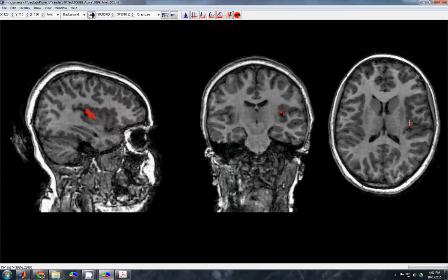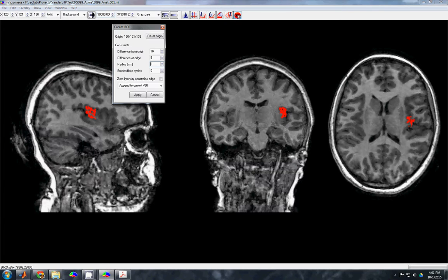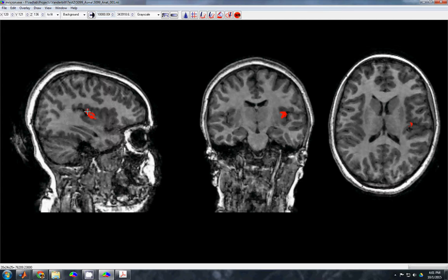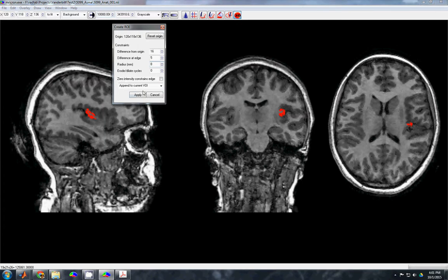Okay, in some ways it's a bit better to be liberal and over-capture than under-capture, because if you miss something, we know we can't catch it, whereas if you catch too much and we combine your results with a few other people's results, then we'll be able to hone in on the part where you all agree that was brain.